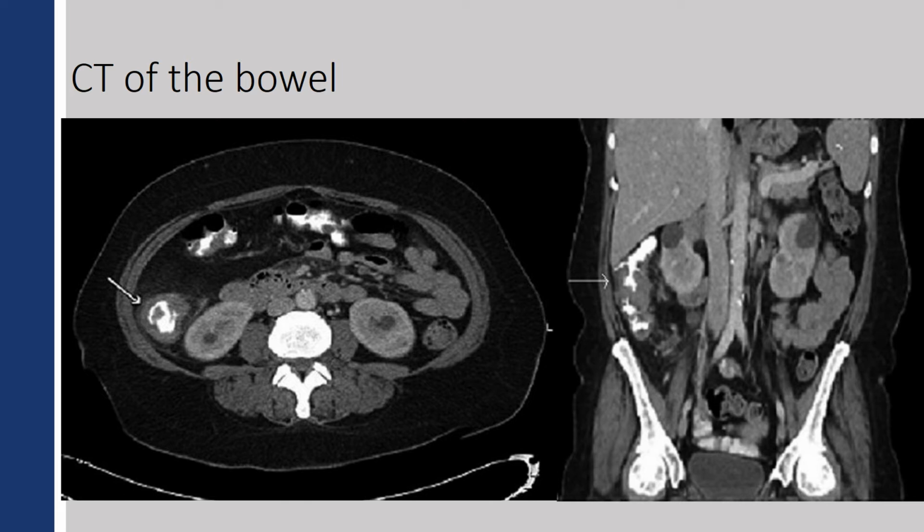So it's better than plain radiography, but we can still have trouble looking at things within the lumen of the bowel. We can have some trouble looking at things extending off the bowel and looking at the bowel gas patterns as well.